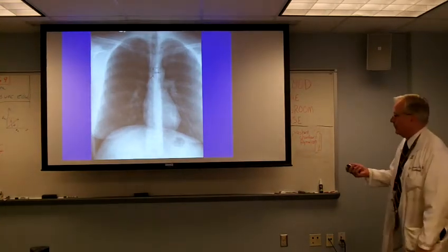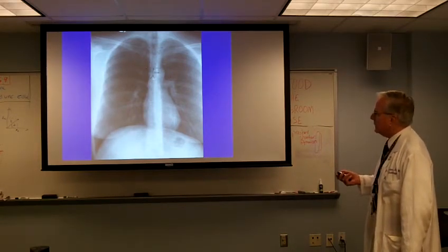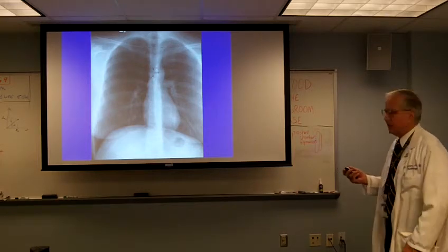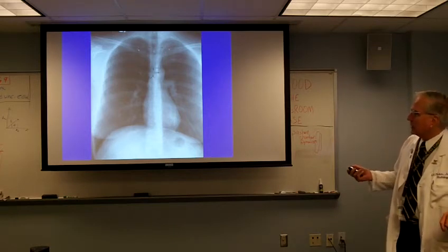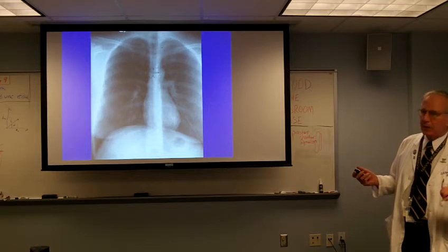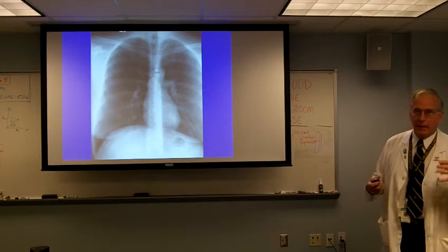And this is that film we saw earlier, the full inspiration film, but what I've done is I've just sort of grease penciled in where the lowest point ought to be, and I use as the upper limit of acceptability the superior aspect of the clavicles. Now, what might be the problem of the tube being too high? Obviously, if it's really too high, then you're extubated.